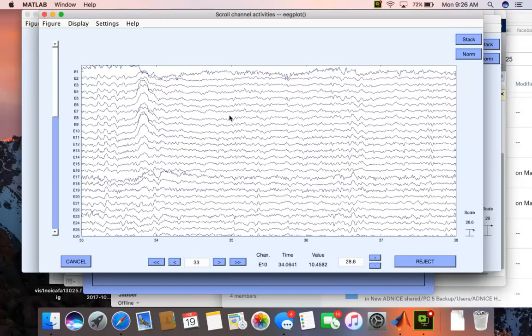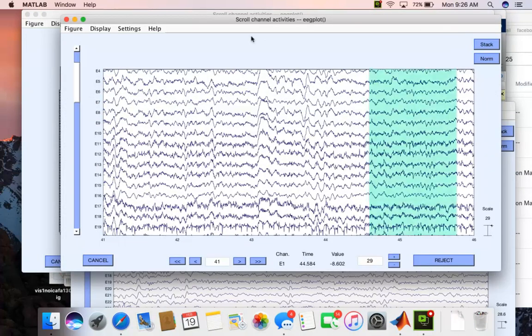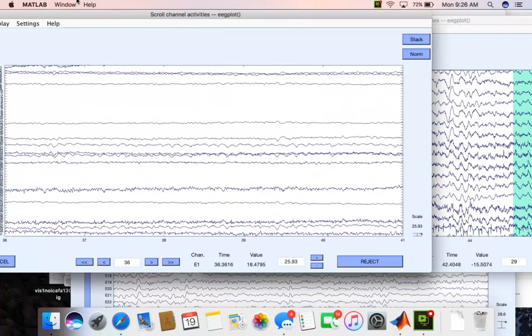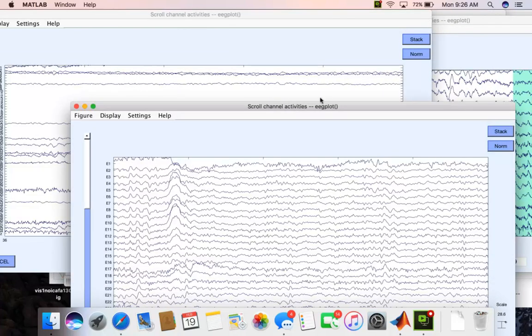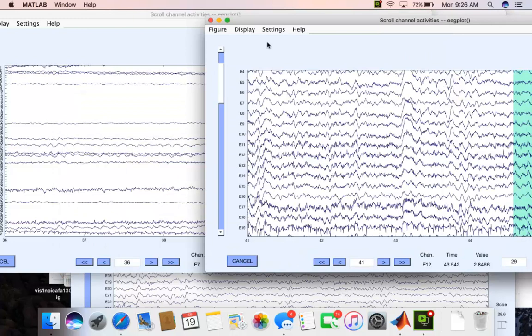And yes, the software is auto scaling the display, so I am seeing some sort of skewing as far as what I'm actually seeing on the display window. But I think you can agree it's pretty dramatic the way just the simple filtering helped and got rid of some of the problems that were in the original two plots.